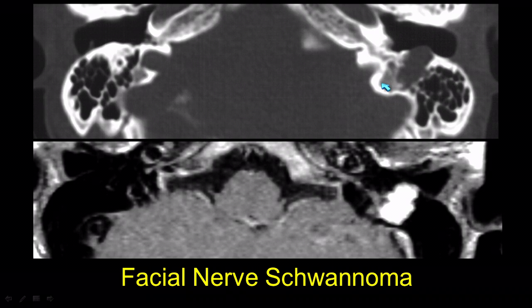So here's an axial CT and the correlating post-contrast MR on bottom, and we see a large lesion here with kind of a lumpy, bumpy outside appearance as it pedunculates into these air cells and extends anteriorly towards the external auditory canal, with avid enhancement following contrast. And we can nicely correlate that with the normal descending mastoid segment on the other side.